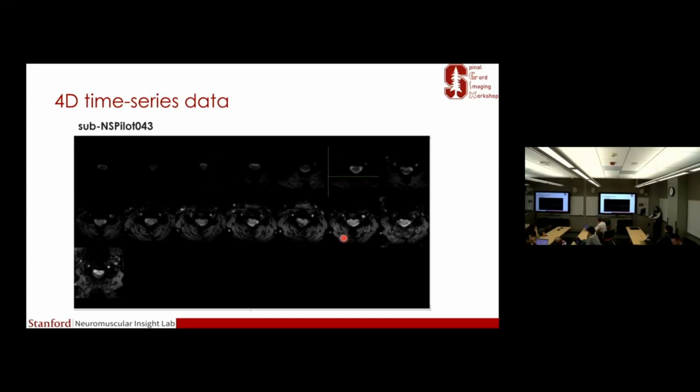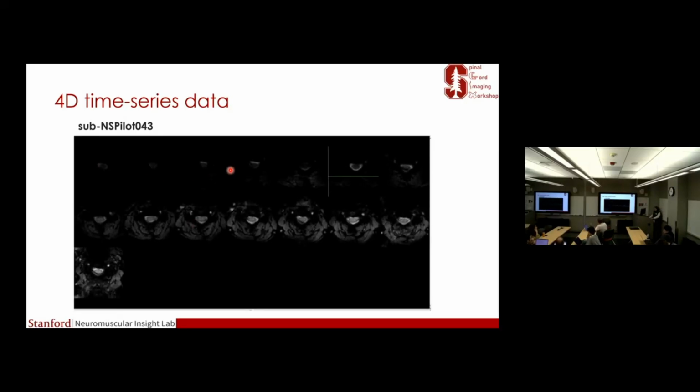So as I said, I would just open it and look at it in FSLeyes just to see how it is looking. See here, there are some nice artifacts here, but they are not going into the spinal cord. You see a little bit of motion, but overall, this doesn't look necessarily so concerning. You can see the signal dropouts are more amplified towards the lower part of the cervical spinal cord.